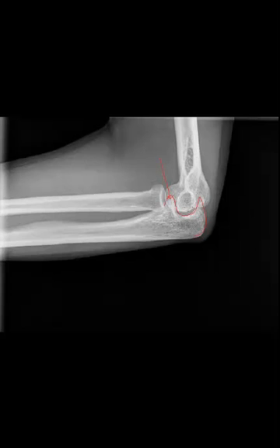Now the trochlea lives here, and this patient wasn't positioned exactly optimally, and you are seeing a little offset between the humeral condyles. However, we can know that this is the trochlea because the capitulum we've already identified articulating with the radius here. Now there's a soft tissue region that you need to pay close attention to, and the region is back here behind the humerus.